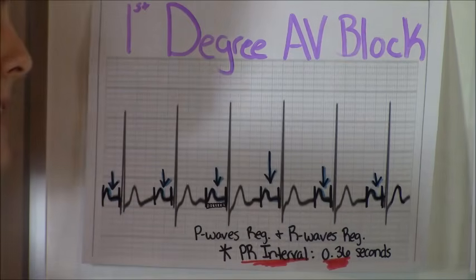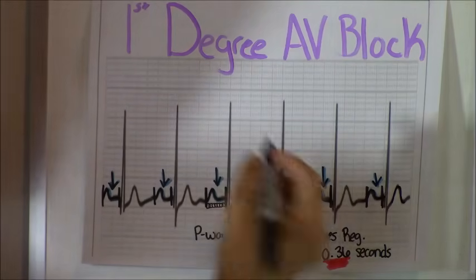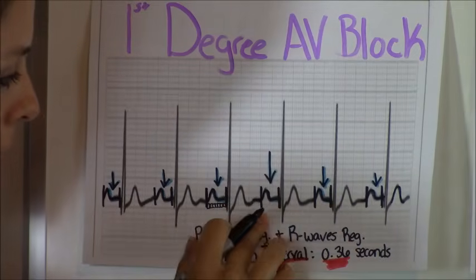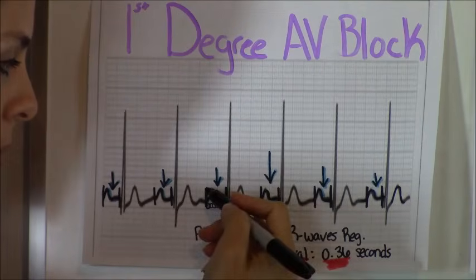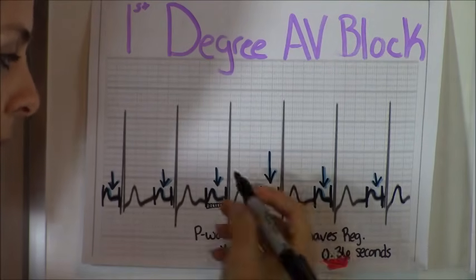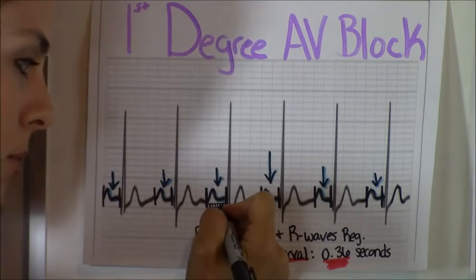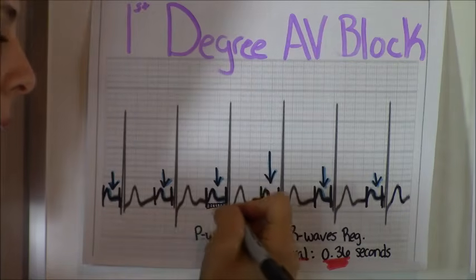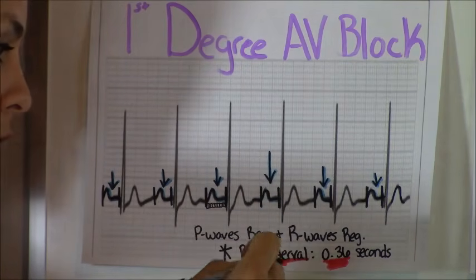we've got to go to our last step, step 5. That is where we look at the PR interval measurement and the QRS width, but we're really concentrating on the PR interval. Probably on the video you can't see as well, but I've tried to highlight these little boxes. Whenever you're measuring the PR interval, you're counting from the beginning of the P wave to the beginning of where the QRS complex starts, and you're counting these small boxes. Remember, each small box represents 0.04 seconds of time, and a normal PR interval is less than 0.20.